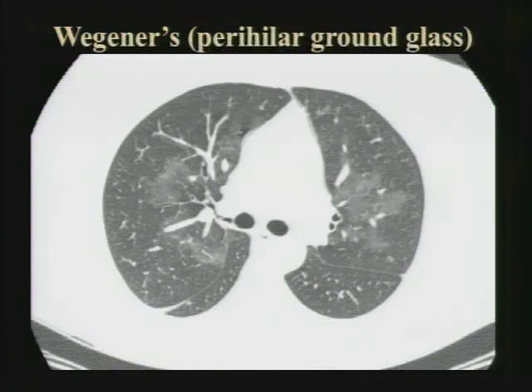This is someone with symmetric perihilar ground glass opacity. Ask the symptom duration. Patient symptoms were acute. Viral infection, hemorrhage, diffuse alveolar damage, pulmonary edema. That's our basic differential. Can't tell them apart, no way to differentiate, give that differential.